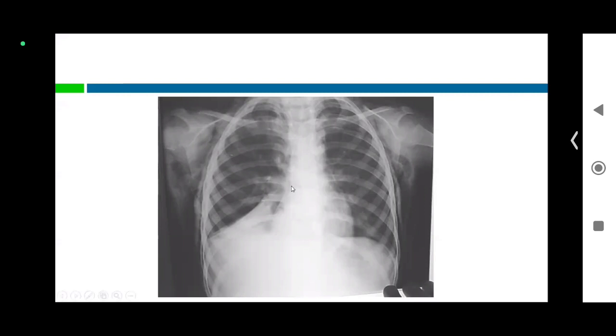A closer look will tell you in places where there should be no air, you have a lot of air. This is the axilla, still you see air. This is the gap between the muscle and the bone, and you are still seeing air. You are able to see air in the axilla, air between the rib cage and muscle. What is it? Subcutaneous emphysema, surgical emphysema.